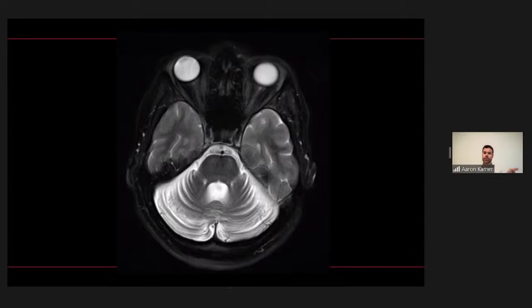There's one other thing that I think about, especially in the setting of an unexplained epilepsy. Now seizures don't usually come from the cerebellum, so this would be much lower down on the differential list. But there are a lot of autoimmune encephalopathies, especially. There's one or two associated as a paraneoplastic syndrome with breast cancer that can have cerebellar atrophy as one of the manifesting imaging findings. So that's something to keep in the back of your mind, even though if it's a chronic epilepsy patient, chances are it's just from seizure medications.